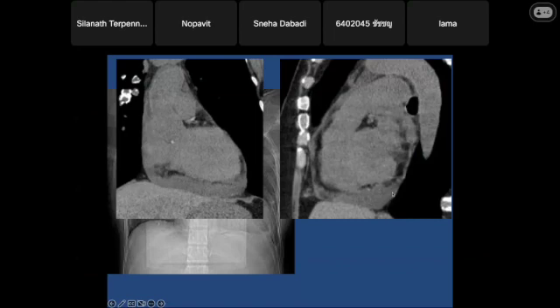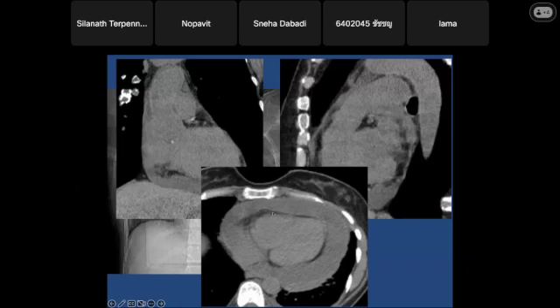When the patient is in the CT scanner, they lie down. So the free fluid will move to the posterior part of the pericardial cavity, here. That's why it's piled up in the back. And this is on the axial. You see that? This is the heart, and this is the fluid. So seeing a big heart on chest radiograph may be dilated cardiomyopathy, very bad mitral valve disease, or maybe pericardial effusion. You don't know just by the imaging. You probably know by the clinical context, but not by the imaging.